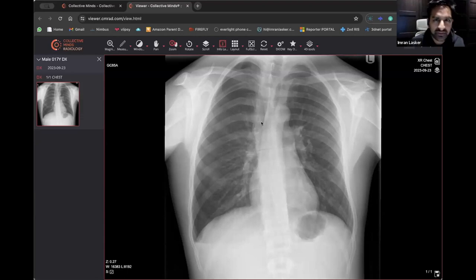And they're quite a young patient as well. So it'd be a bit surprising if there's going to be something sinister like a malignancy. Because when you look at the bones and the edges of the bones, they look very flat, very pristine. They don't look like an old person. When you get older, you can get calcifications of the chondral areas of the rib cage, and that doesn't look like it's happened here either. So this must be a youngish person who's ended up with this particular issue.